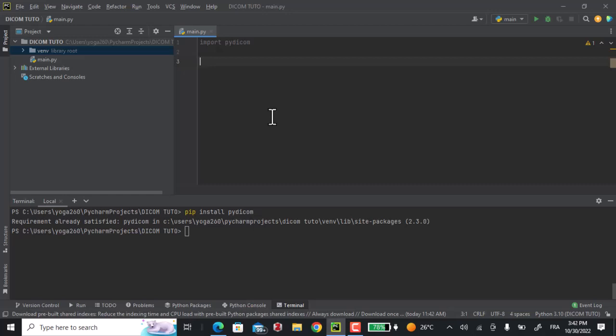In order to show you how to read and handle DICOM images, we first need some DICOM files. You can download them from the internet. You can find many datasets available on the Kaggle website. You should look for Kaggle competitions. Or simply, like in this little tutorial, we can use the images included in pydicom.